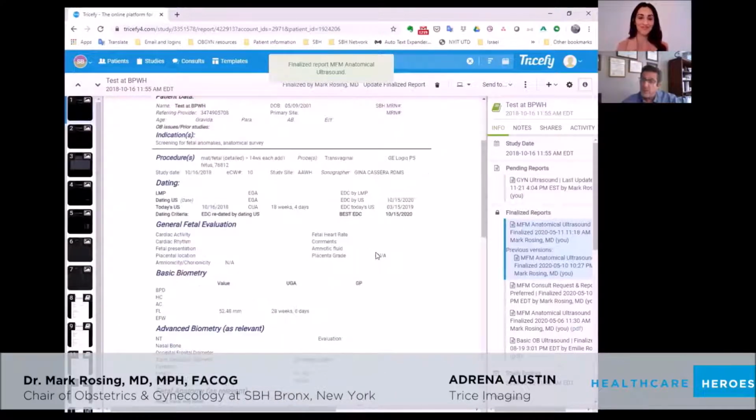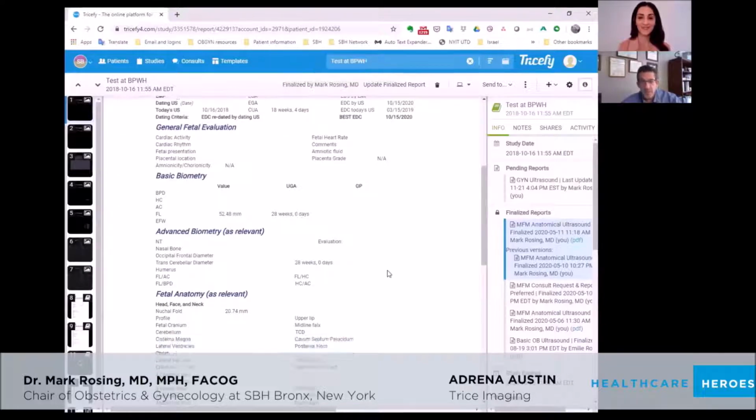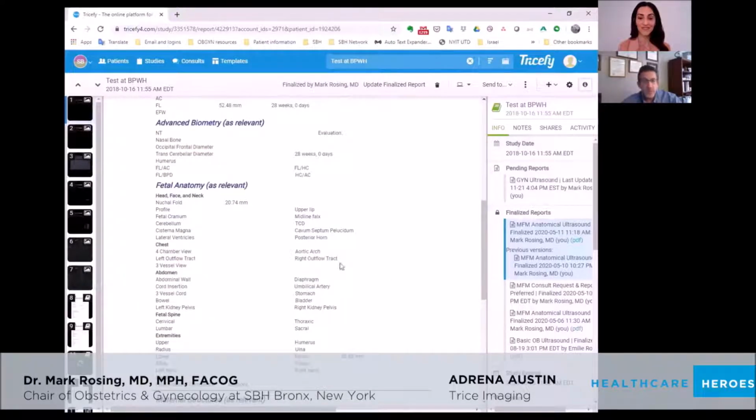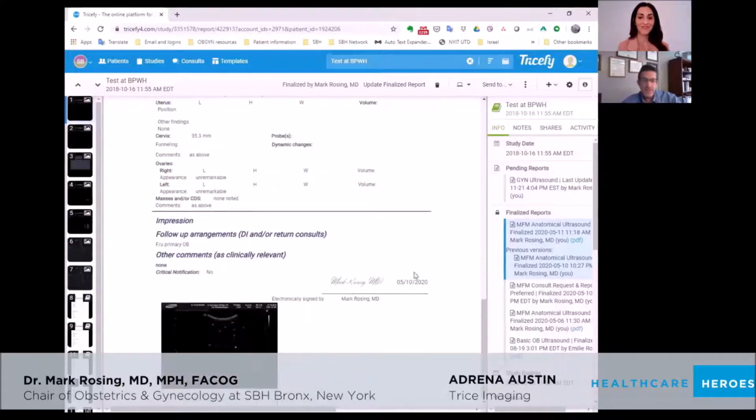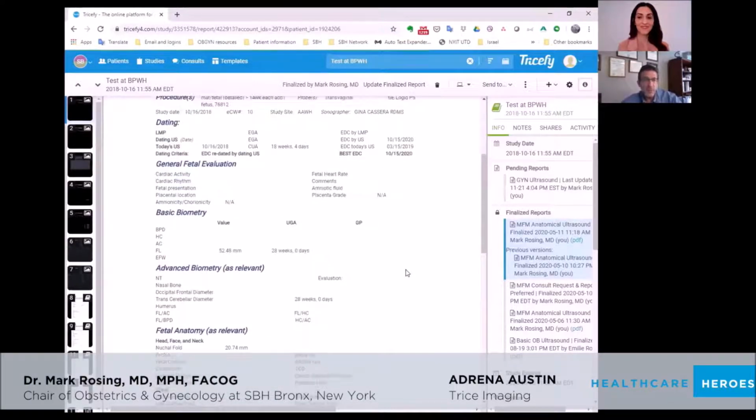So you can see it looks a little bit prettier without all the open fields. But you can see it looks like any report you would see, a really complex, much more expensive report, much less flexible report. But in this case, it's extremely flexible. If the reader notices something's a problem, it can be unfinalized, it can be modified. You can even on the fly add sections if you need to. So that's basically what it looks like. It's a pretty usable, functional, readable report.